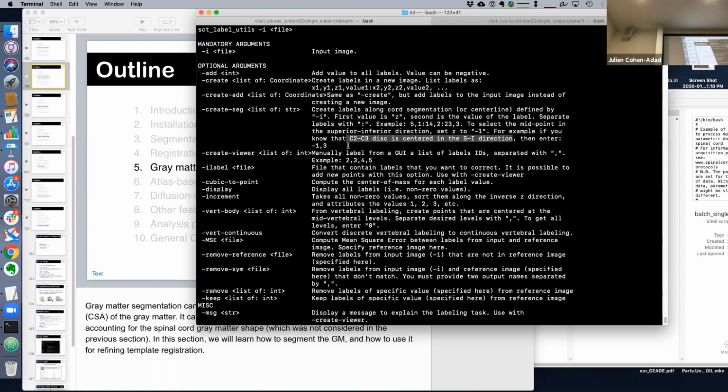Julian, I have some bad data to show you. I randomly picked a subject, and I didn't know if it was going to be good or bad, and this one is actually the worst. I picked the best worst case scenario. It's a high resolution sagittal.